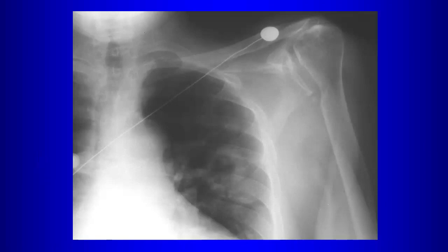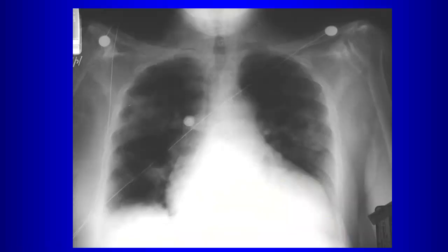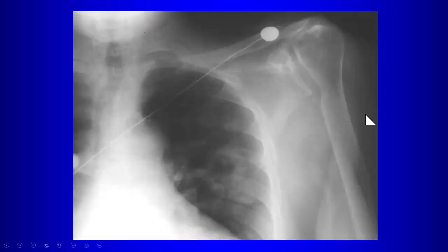Why do you mention that? Because they have some shoulder changes. There are pretty extensive rheumatoid changes in the shoulder. You have high-riding shoulders, you have erosion of the distal clavicle. What is this thing? That's an erosion, right? Is the disease unilateral or bilateral? Yeah, you have bilateral symmetric arthropathy with erosion of the distal clavicle. So this is a patient with long-standing rheumatoid arthritis, okay?